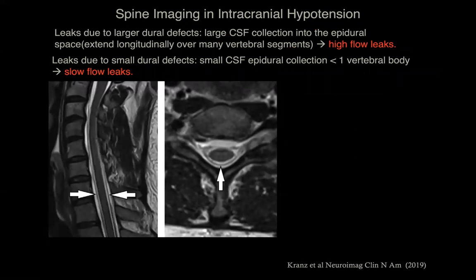And in general, even in the cases that before were called idiopathic, we have evidence of CSF leak. They can be high-flow leaks or slow-flow leaks, but you will often, not all the time, but often, have this epidural fluid, increased epidural fluid.